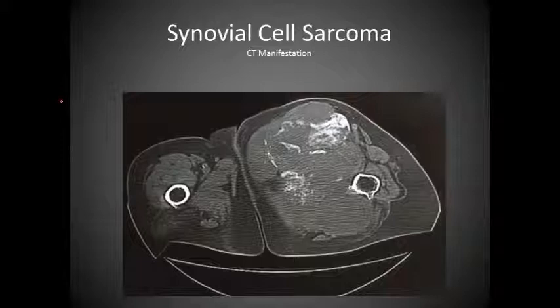This image really demonstrates the snowstorm effect. As you can see, you have an enlargement here in the femur, and we can really see that in comparison to the right side. However, on the left side, we do see that we have this mass, and we see that we have incomplete calcification of this mass throughout. We have these areas here, and this is what mirrors a snowstorm type of effect. And actually, I need to draw on down here because this is where the mass extends, and we do even have some calcifications on down.